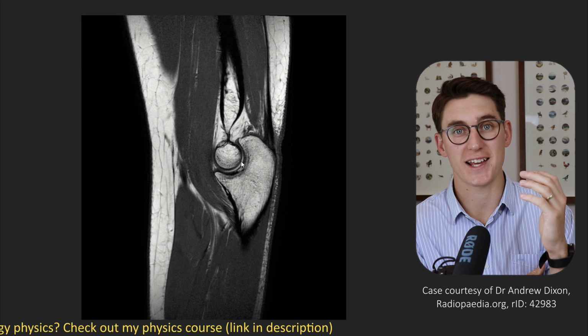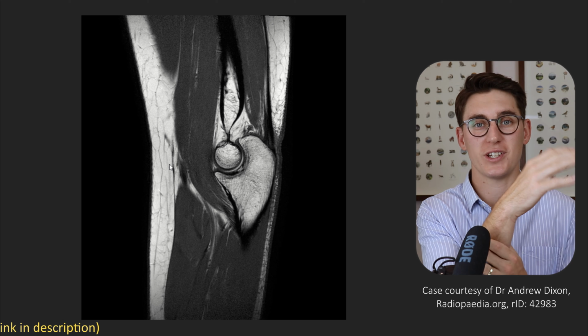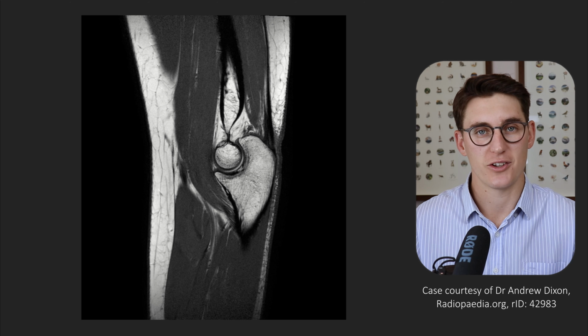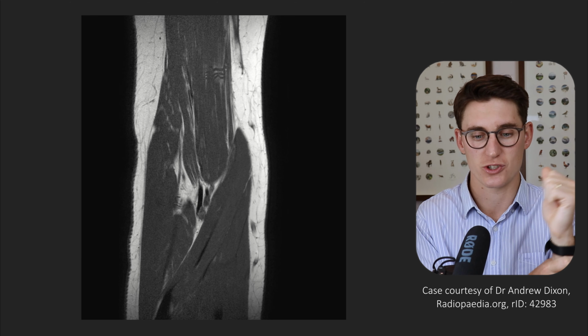So those are the major flexors and extensors of the elbow, but we have a couple of muscles that cross the elbow that are involved in wrist flexion and extension. And those actually don't contribute to flexion and extension of the elbow. Their action is at the wrist joint.